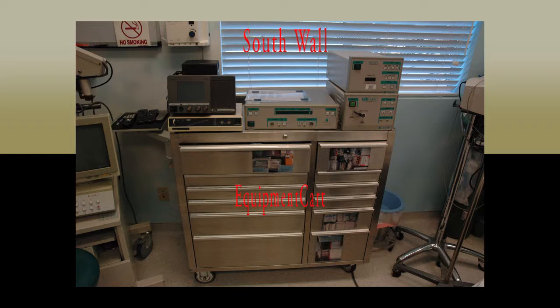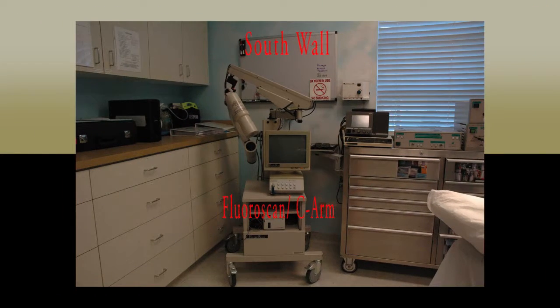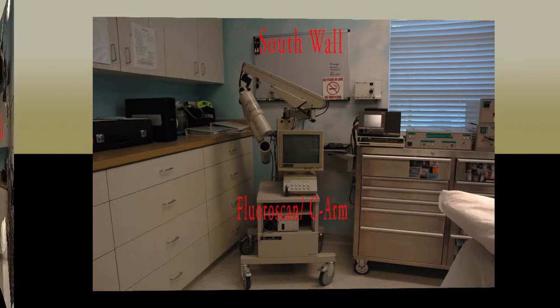cart. Sitting to the left of this cart is the Fluoroscan or C-arm. It is a portable, real-time X-ray machine used by the physicians during surgery to ensure proper fixation has taken place. You will be responsible to have it turned on and prepared with a sterile drape for use during surgery.